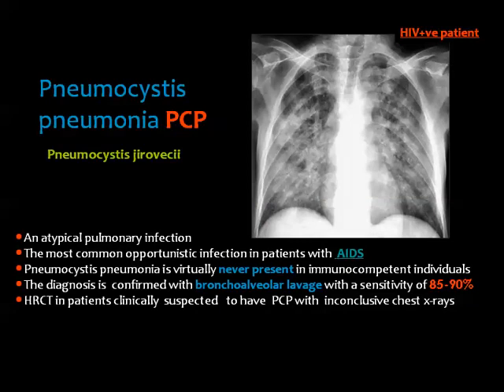The pneumocystis pneumonia, recently known as pneumocystis jirovecii, is the HIV-related pneumonia. If you know that the patient is HIV positive, then any changes in the lung, if they are in the form of reticular opacities or consolidative opacities, you consider the possibility of pneumocystis jirovecii.